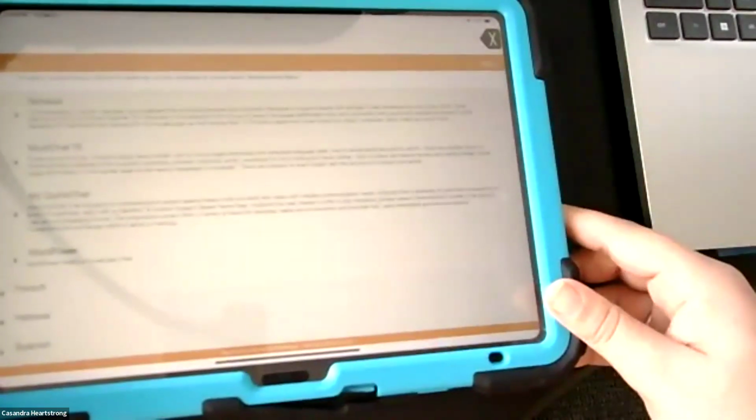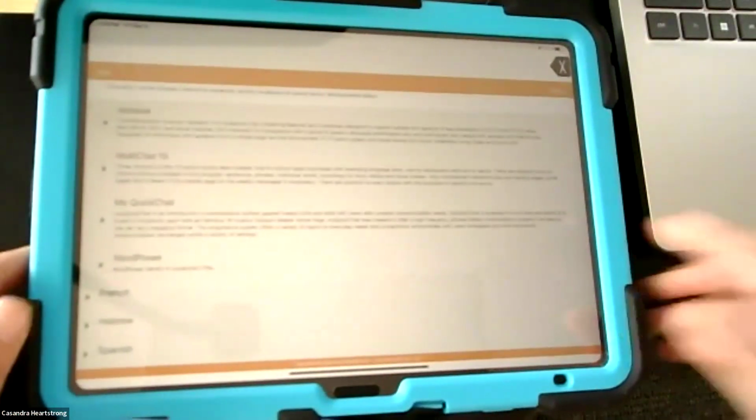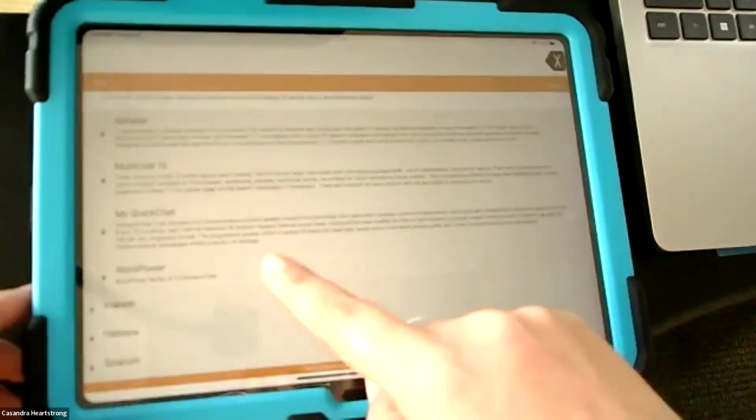I'm going to work on that really quick for you, Anna. There we go. Does this help a little? Okay, I think that will be a little bit better.